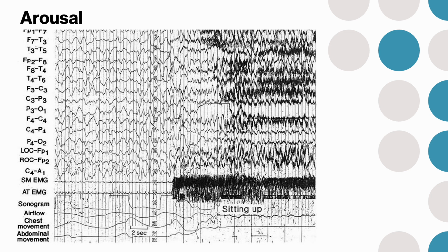You can see some alpha riding on these waves. Right here, they've still got slow waves, but there's alpha on those slow waves. And the darkness of the wires that we see here could just be tension artifact, because since the patient is sitting up, they could be pulling on those wires, and that's what it looks like if there's tension in the wires.